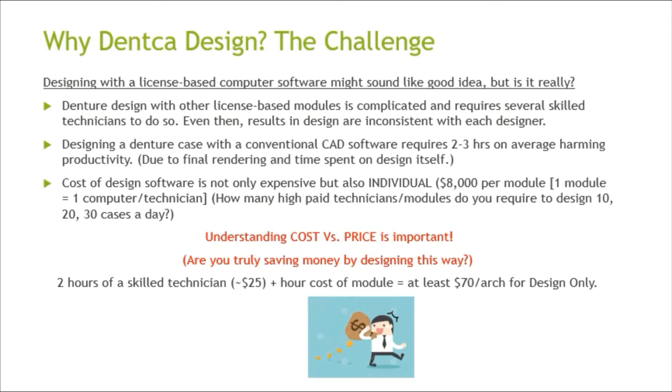DENTCA, on the other hand, has a web-based software where everything is designed and rendered online. So once you finish a case after designing for 15 minutes, you can send it for background generation. It will design by itself in an hour, and you can start a new case as soon as you send the previous case for background generation.